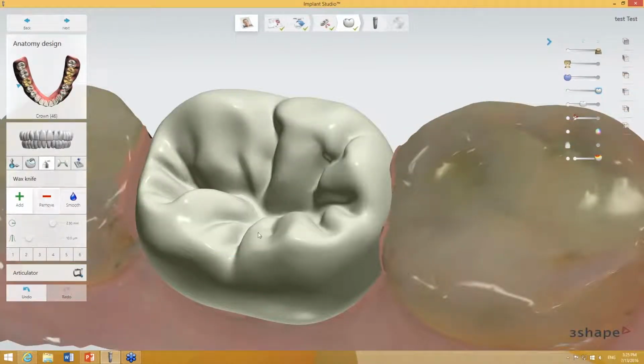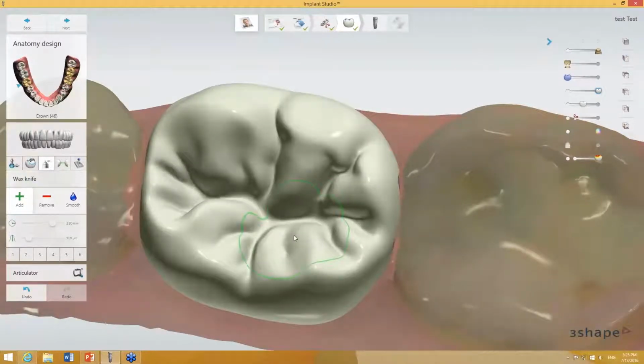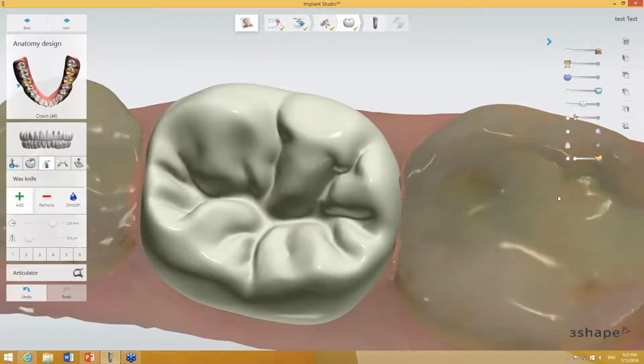And the second one, if you want to go slightly deeper and more precisely in your design, you can also use the removing tool. But this time I will flip the settings entirely to the opposite side. So use a small radius and big level, or big amplitude in this case. And this one will very nicely turn into a carver.